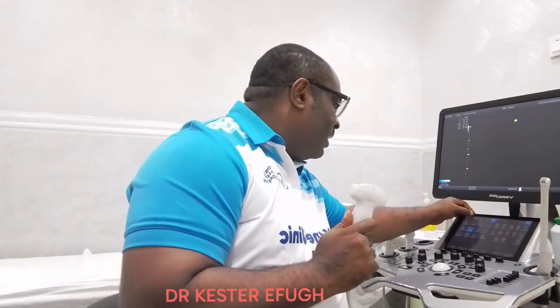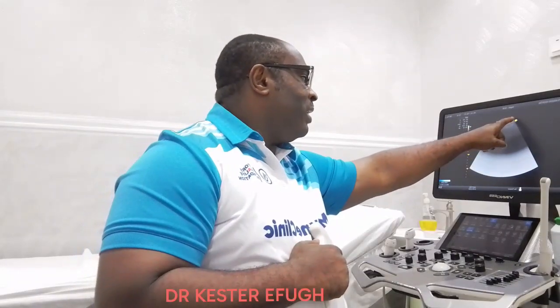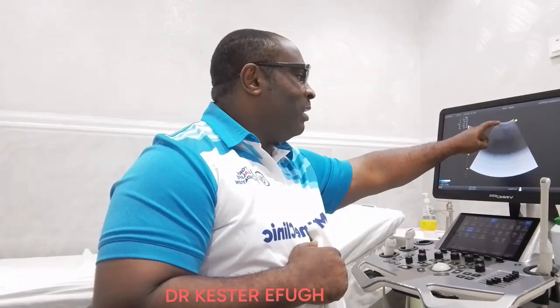And the curvilinear probe on the monitor will give this form of outline. That's the shape that you see on the screen. With the curvilinear probe, you have this trapezoid outline with a curved upper border. So when I see this field of view without looking at the type of probe, I already know that a curvilinear probe is activated. So one type of probe you must know, and we use it quite a lot, is the curvilinear probe for our abdominal scans, pelvic scans, and obstetric scans.